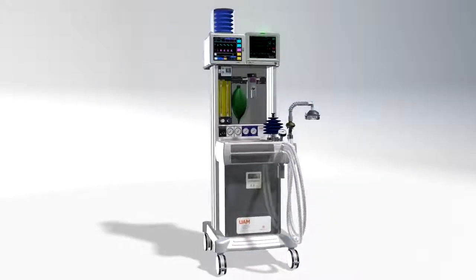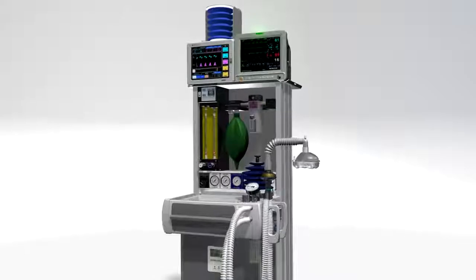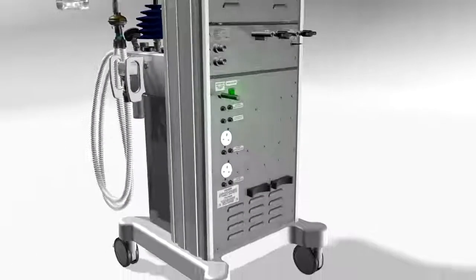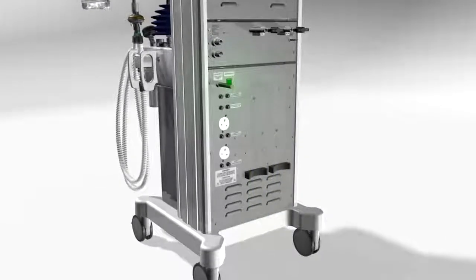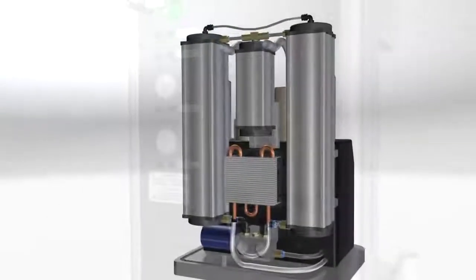The universal anesthesia machine ensures that an adequate supply of oxygen and anesthesia is always available to meet patient demand, no matter what the environment. The UAM provides several ways to deliver oxygen, including connections for cylinder and pipeline. Most importantly, the machine produces its own oxygen using an integrated concentrator that enriches room air.